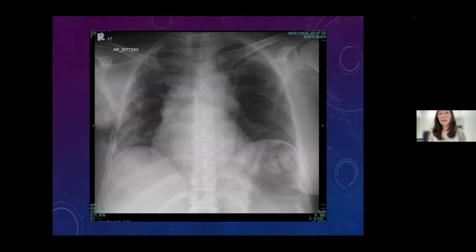All right. So next, this one. The heart is big. Easy one. The heart is big, this is very easy. Let's see more findings from the lung field. Pneumonia, maybe a patchy consolidation here, then a nodule here at the right mid zone.